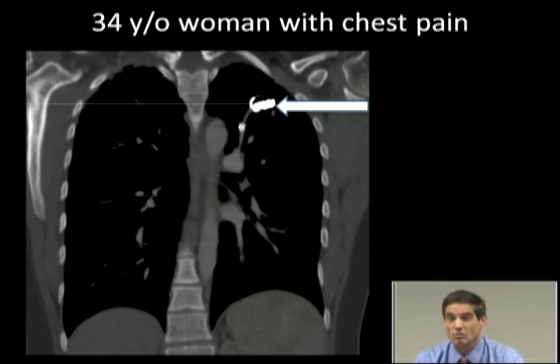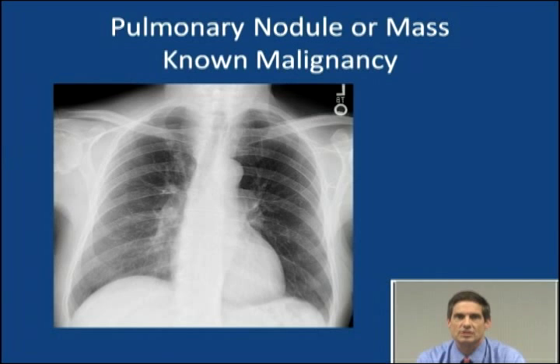so the vessels are kind of gray at this particular window and level setting. The bright white stuff marked by the arrow is the embolic material plugging up her AVM. Her shunt percentage went way down, and she got much pain relief after embolization of her arteriovenous malformation. That's a little bit of an unusual cause.